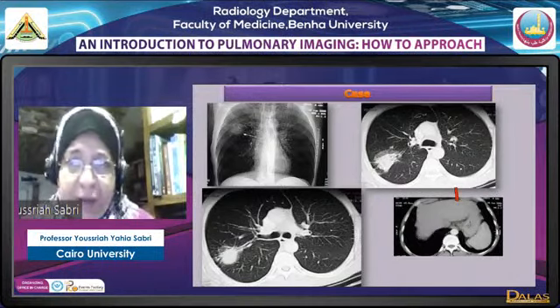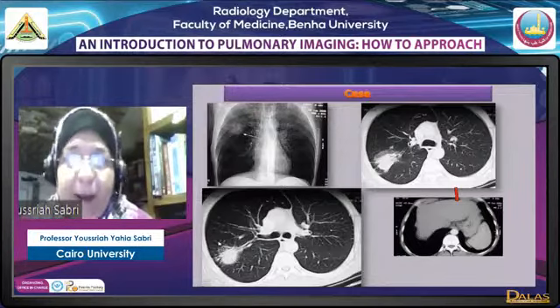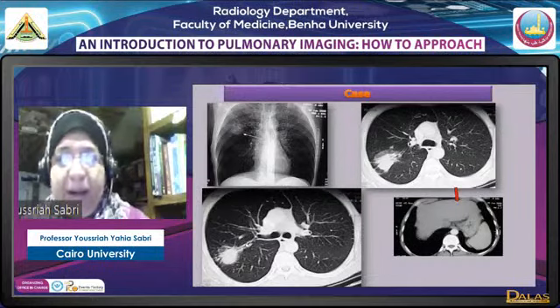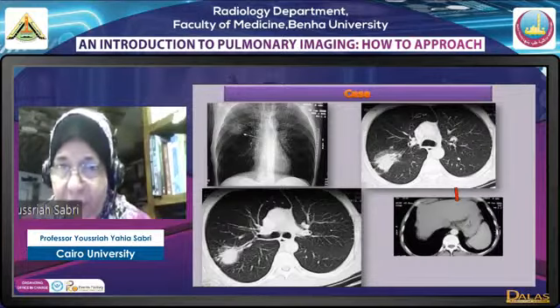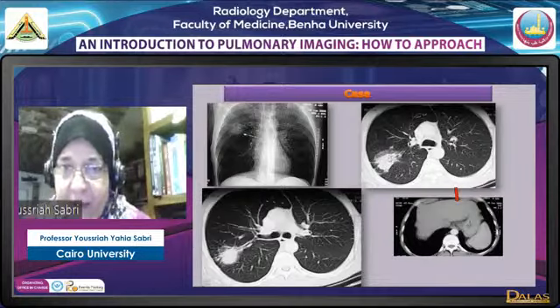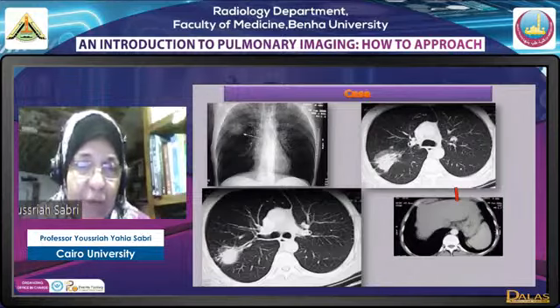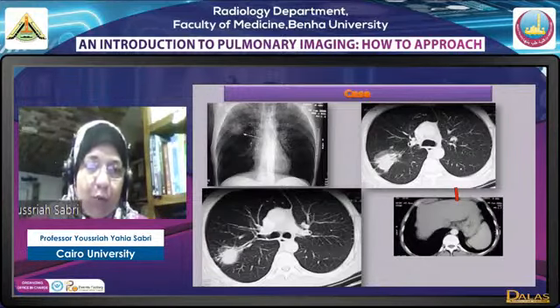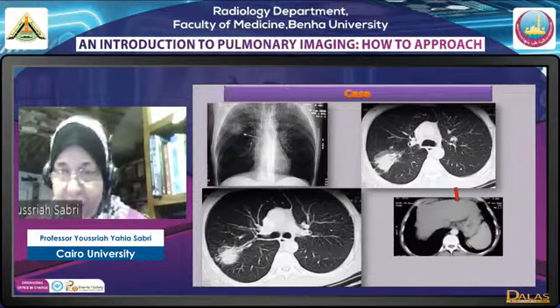So these 3 signs are very important signs suggestive of morphologically ان انا بتعامل مع حاجه ماليه. طيب الحاجه الثانيه الليجن ده موجود فين؟ احنا شايفين ايرواي يبقى احنا upper lobe او apical of lobe. ادي مكان الفيشر اهو وادي مكان الفيشر، فده احنا كده ليجن قدام الفيشر ده apical of lower. الحاجه سوري posterior of upper. الحاجه الثانيه ادي الابر لوب برونكس داخل اهو مدي anterior segment و posterior segment، فالليجن ده related للposterior segmental bronchus.